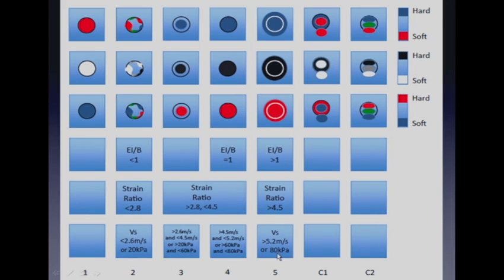And all the papers that showed if it was greater than 80 kilopascals have shown those to be cancers, so we'll give that a 5. In our hands, we use 60 kilopascals, and other people have come up with 60 as their cutoff number also for malignancy, so I gave that a 4.